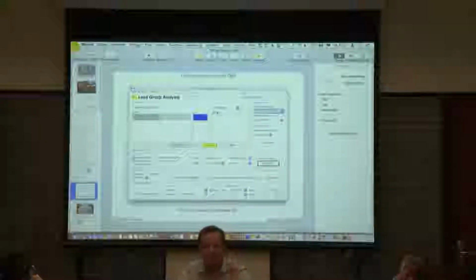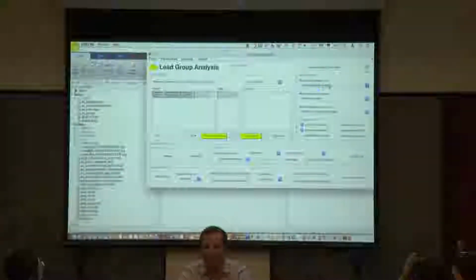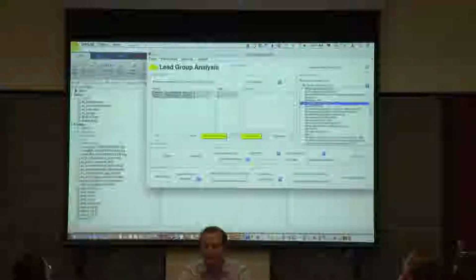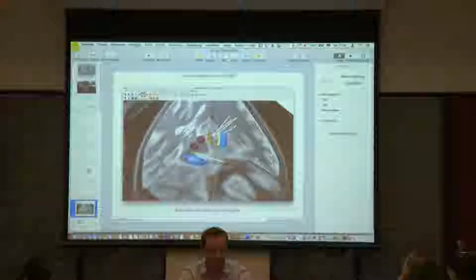We define group colors, and so the atlas that we want to show is up here, and then it's visualized in 3D. So that's up here. My MATLAB seems a bit broken. Okay. Now we can, as in the main GUI, just use a different atlas. So that's nothing special. And we have two groups here as well.